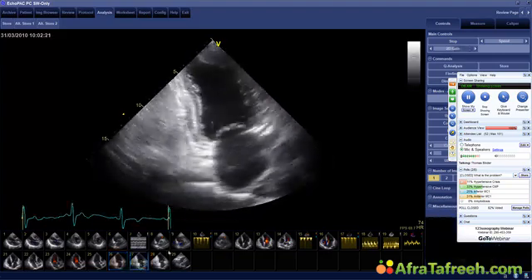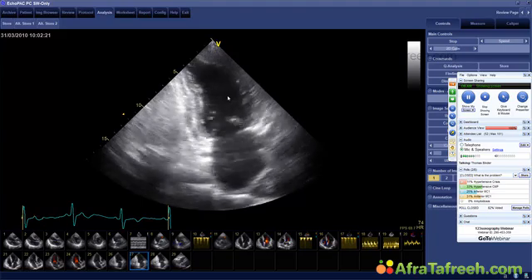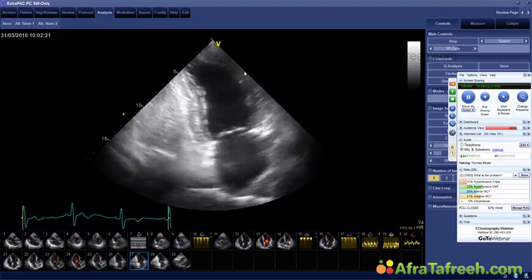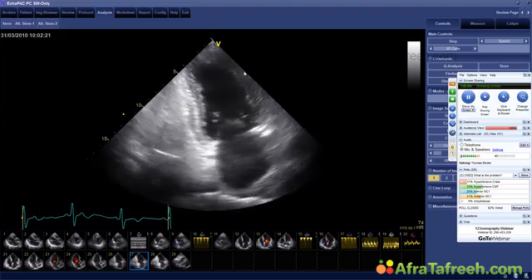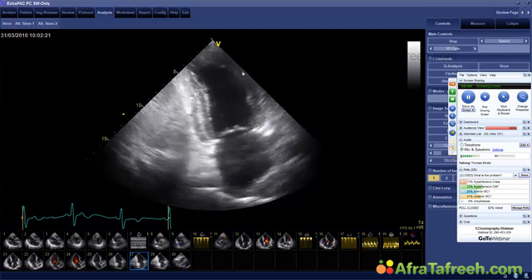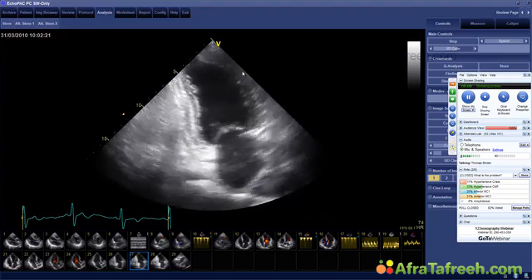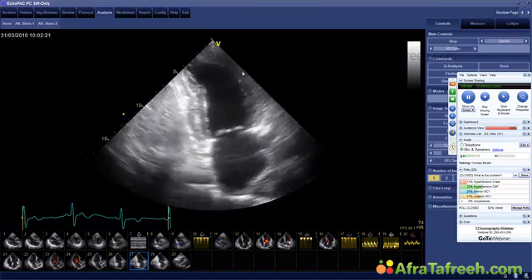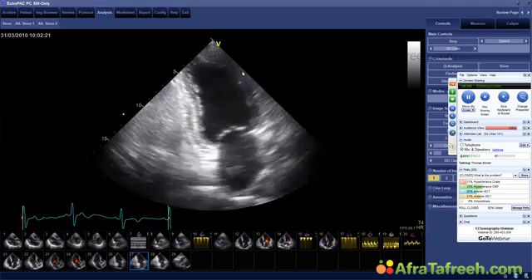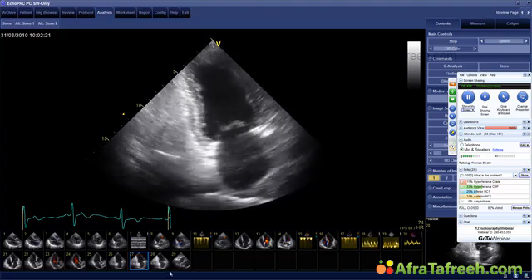So in summary, what I would say to these images is that the patient has a wall motion abnormality in the apical segments and the anterior segments. Now, what does the patient have? Well, he had an acute anterior myocardial infarction. Of course, he also has left ventricular hypertrophy caused by severe arterial hypertension. The patient had blood pressure values all over the place between 180 to 110, even above that, and even came in with very high blood pressures. So he was brought to the cath lab, and what we found was that he had an LAD occlusion, and the vessel was reopened, and everything was fine.